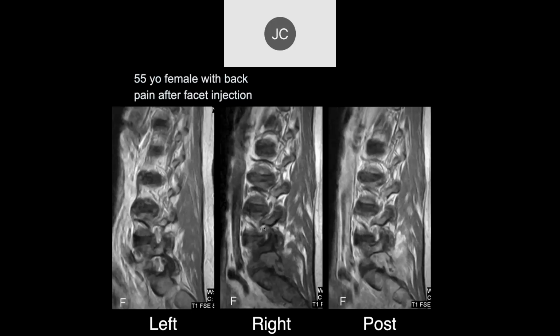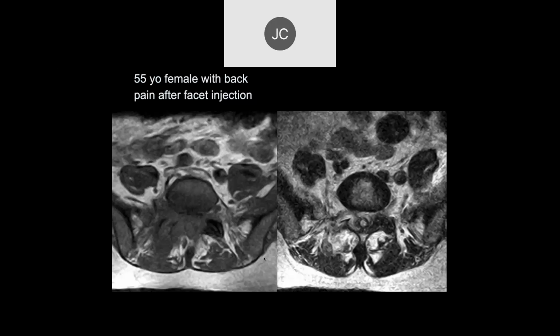And here you can see the nerve roots coming in the neuroforamina above. If we get to 5, you can see the nerve root with a little bit of fat around it there. But what do you see here? Yeah, there's like a hypointense signal which enhances. Right, and you don't really see the nerve root there, right? No. And because there's no fat, there's no contrast around it. And here, if we go to the axial images, what do you see? On the right side, you lose that. It's like infiltrated into that foramen as well.